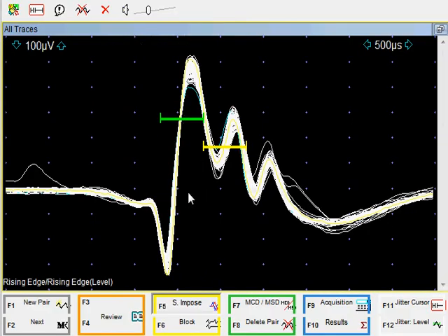What is a good position for placing the window? That's a question that I often get asked. You always want to trigger at a location where you got minimal activity from background signals, but that's not necessarily the best location for jitter analysis. It should be on the sharp portion, and I usually like to place it near the baseline or halfway between the peaks. So this is where I would position it.